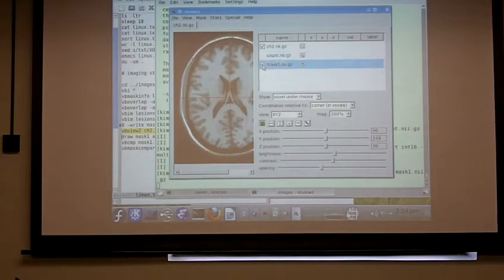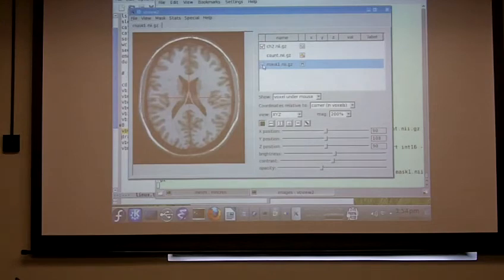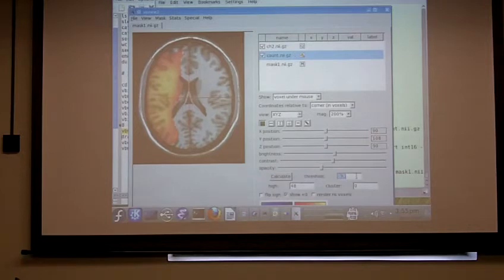One thing you can see right away is that the mask has nothing in it. At least not on this slice. Of course, it has nothing on it anywhere because you all saw me set it to 0. Here's the count map, which by contrast has data everywhere, just about everywhere in the left hemisphere, really frequently. And some of these voxels were lesioned in as many as, I just saw 42. There may be higher numbers somewhere, probably not too much higher. And they go down to 1. And then where it's 0, you don't see any color. We could, if we wanted to, set a threshold at 20 to only see really frequently lesioned voxels.